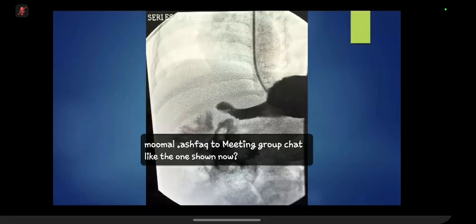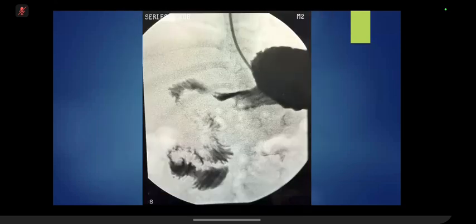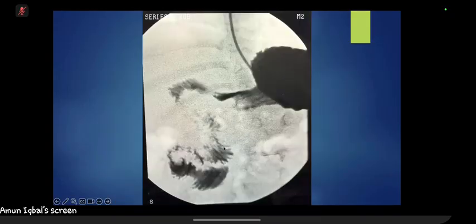So it's a less likely possibility that they will show you a non-rotation case. But if they do, remember that the axis in the center is the point which tells whether the patient has non-rotation or intestinal malrotation. If you see some angulation, the bowel is twisting and trying to move to the central part of the body but still remaining there, that means it could more likely be a malrotation case.